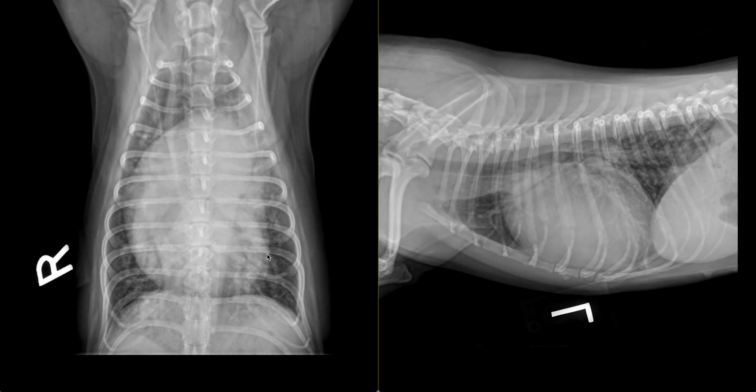The diffuse interstitial pattern is likely due to a combination of the severe hypervascular disease and a component of pulmonary edema is also possible. There is mild compression of the main stem bronchi as well. The generalized enlargement of the pulmonary arteries can also be seen with heartworm disease. However, the cardiac enlargement is more consistent with the volume overload, and in combination with the large arteries, prioritization is given to a congenital cardiac defect with left to right shunting.